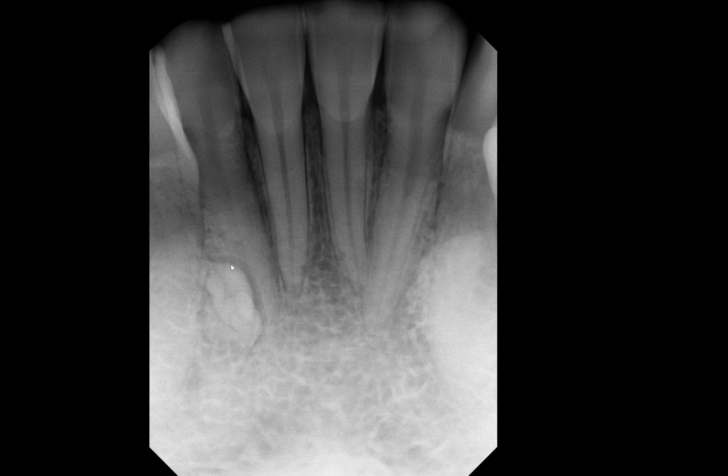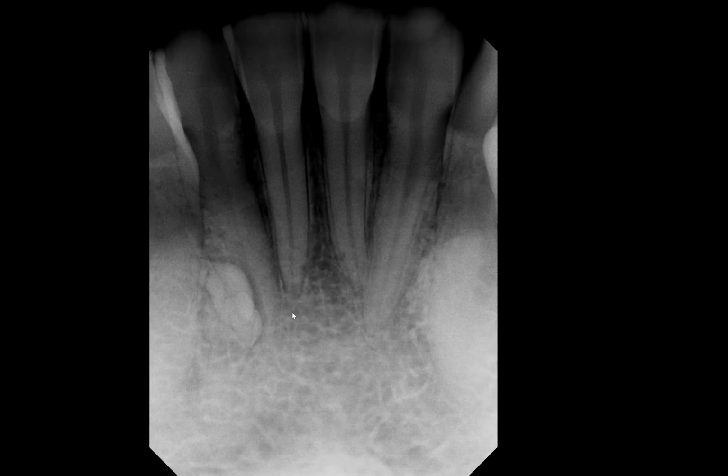of mixed density lesion, right? So let me see if I can adjust the contrast to bring out its border. You do see a radiolucent rim about here, right? As best as you can, that's probably where it ends. I can draw all the way here, but I'm not sure you can confidently see that, and that's better visualized on the other view. But I hope you can at least trace this radiolucent rim, and internally it has kind of wide range of densities, right? Some areas appear very radio-opaque, and some areas there's some lucency, and so there's a kind of mixture of very opaque area and radiolucent areas.